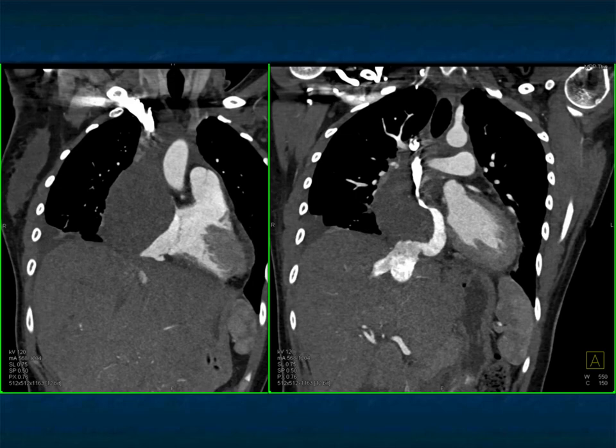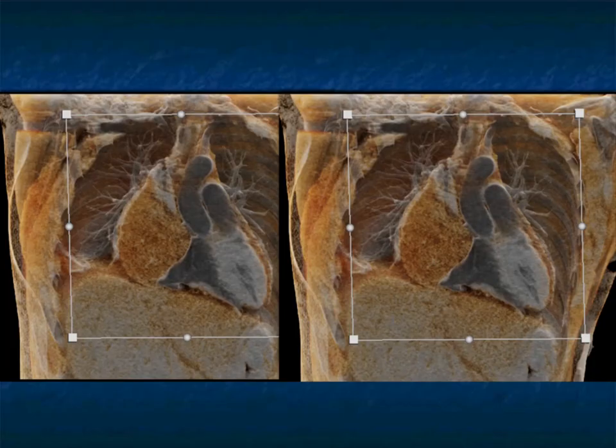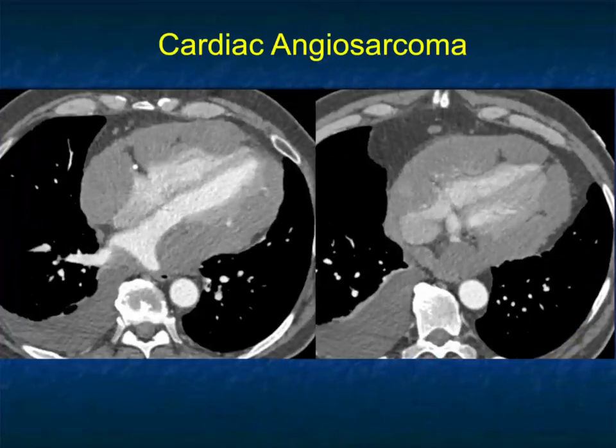And here it is in coronal views where there's also involvement of the SVC, which is narrowed. Again, you could think about what else could this be. I guess my differential would somehow include lymphoma. It's always a good thought. And probably metastasis, just because I could think of nothing else. And again, on the cinematic rendered views, very, very nicely shown this patient's mass.